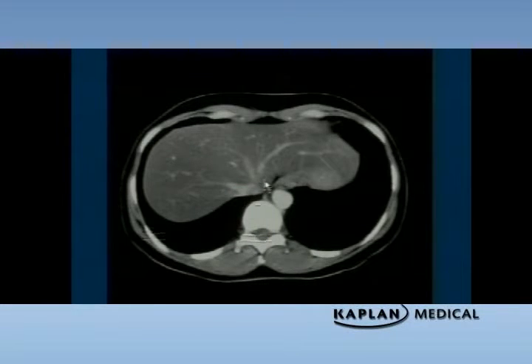This is also normal, showing you a different cut. This is the liver. This is the vertebral body, the cord, the rib, the paraspinal muscles. You notice how liver comes out to be in between the density of bone and air, because that is what its density is. These are blood vessels in the liver. These are hepatic vessels coming out from the pedicle here, going through the liver.